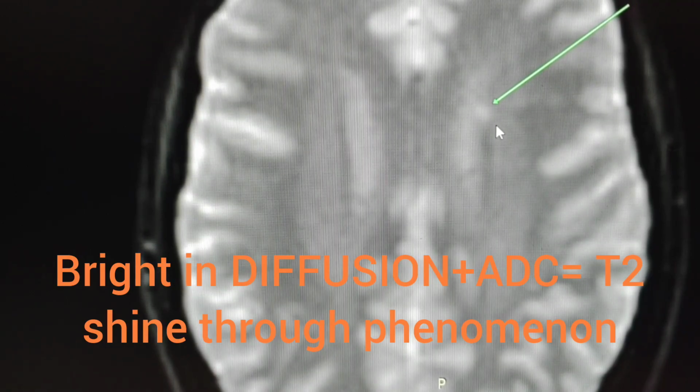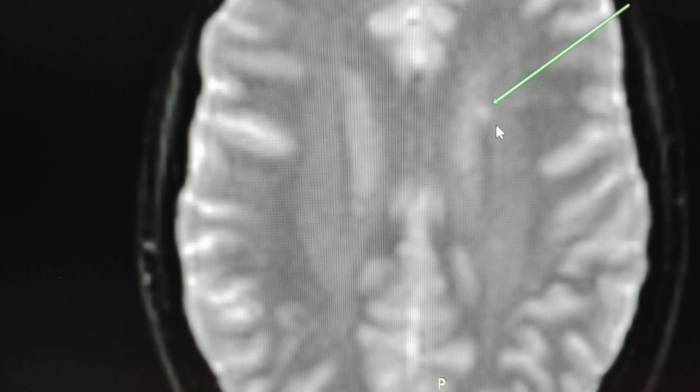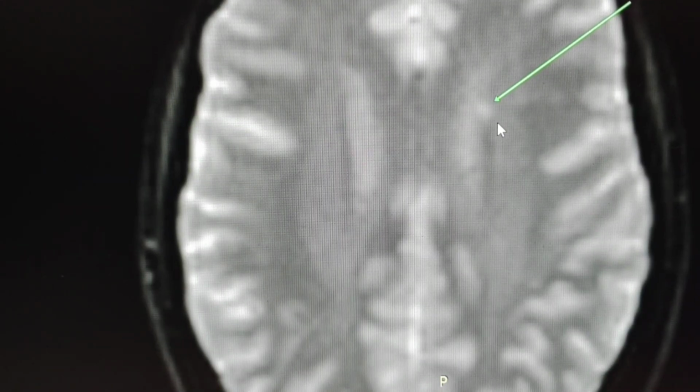In contrast, true restricted diffusion, for example in an acute stroke, will show up as white on DWI but dark on ADC. And now, given the opportunity of this example, I will list the possible explanations of this lesion in theory, not just for this case.